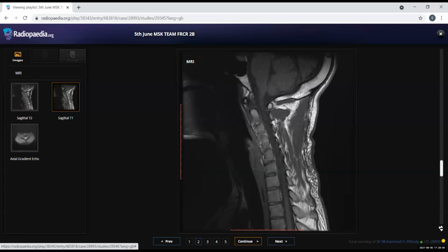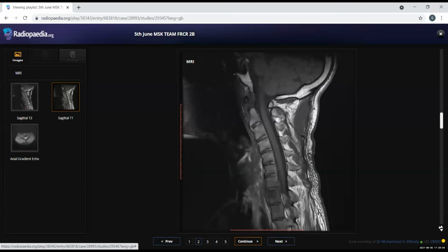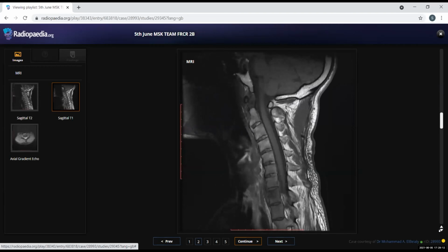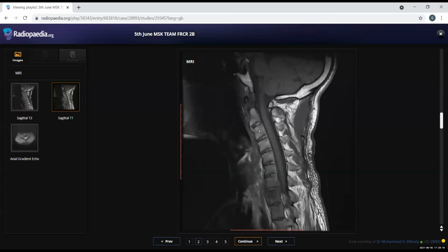Can you look at all the vertebral bodies very carefully? You're right about the appearance of fusion. Okay, one of the vertebral bodies shows an abnormal signal density lesion. Let's see, C2, 3, 4, 5, 6, 7, and T1.